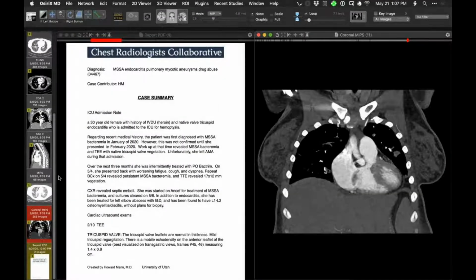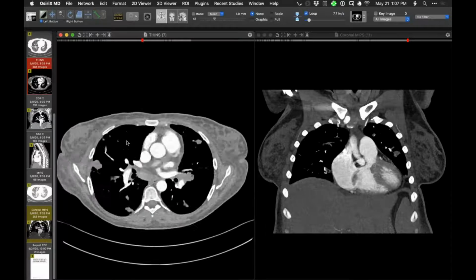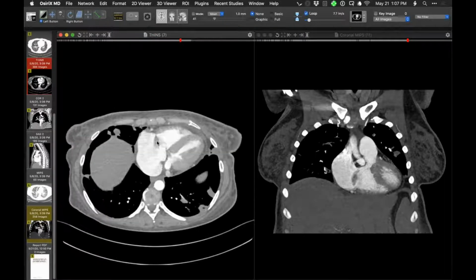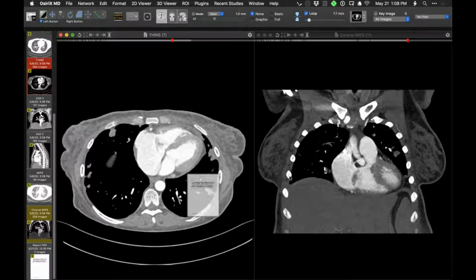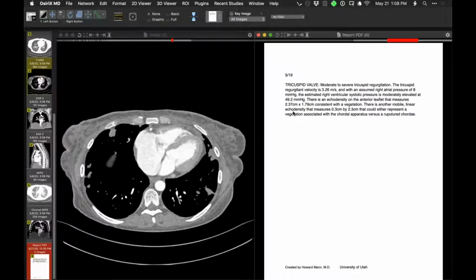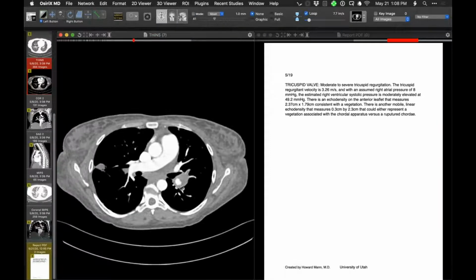And to go back to the axial CT, I think that we have findings of vegetations in the tricuspid valve. The more I looked at the valve and the surround, I think there are large vegetations there. And she did have large vegetations and even increasing vegetations in relation to the tricuspid valve, most recently just 2 days ago. So septic embolism, tricuspid valve involvement, but with multiple mycotic aneurysms, abnormal tissue, but I don't think any of these represent bland embolism.